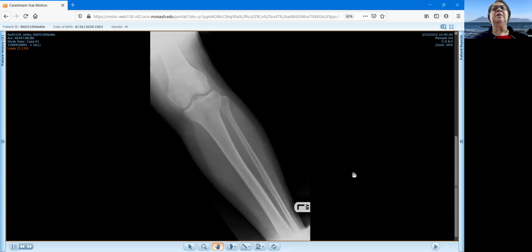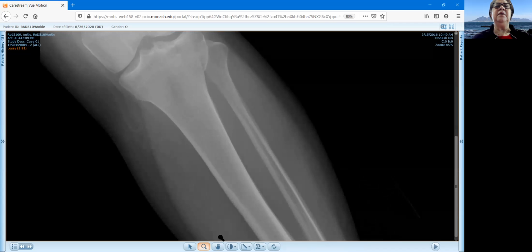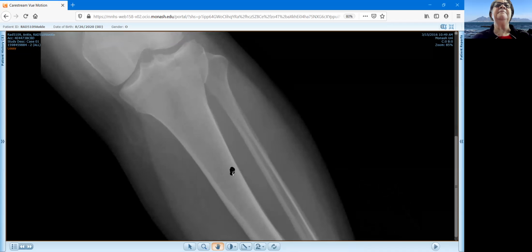So for case 1, we have a patient, a dog ran into the left knee and lower leg, and there is now tenderness of the head of the fibula. So I'm just going to zoom in to the knee area, the area of concern.